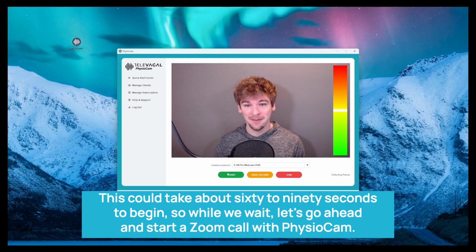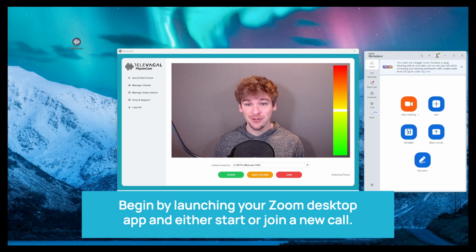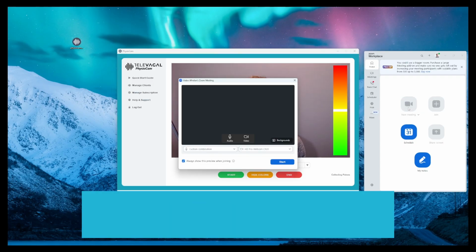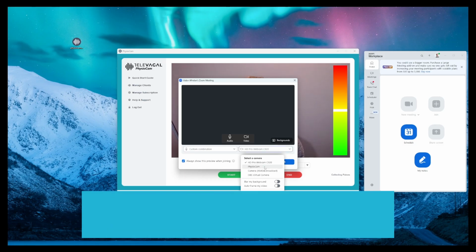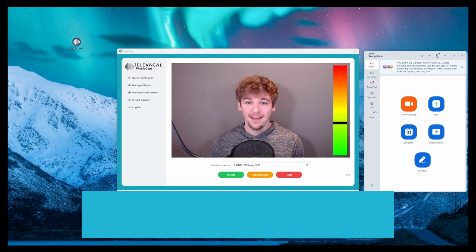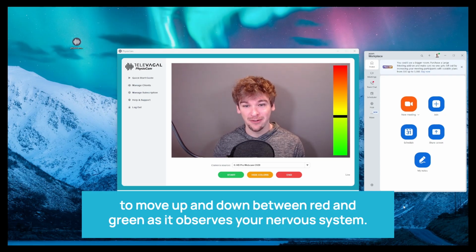Zoom call with PhysioCam. Begin by launching your Zoom desktop app and either start or join a new call. With PhysioCam installed on your computer, you'll now see that PhysioCam is listed among the available camera sources in Zoom. Selecting this camera source will use your PhysioCam video, including the color bar, as your personal video in your meeting. After the calibration phase has ended, the indicator on the color bar will begin to move up and down between red and green as it observes your nervous system.